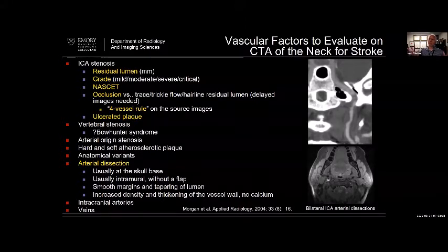Different people are different sizes. Some people are 7 feet tall, some people are 4 feet tall. So it takes into account a ratio, which I think is a good thing. But ultimately, if something's down to 1 millimeter, that's pretty tight, no matter what it looks like distally. And don't forget, because of Poiseuille's law, the distal pressure can be decreased, and you can get what's called a slim sign, so that ratio might not look as bad as it actually is in real life.